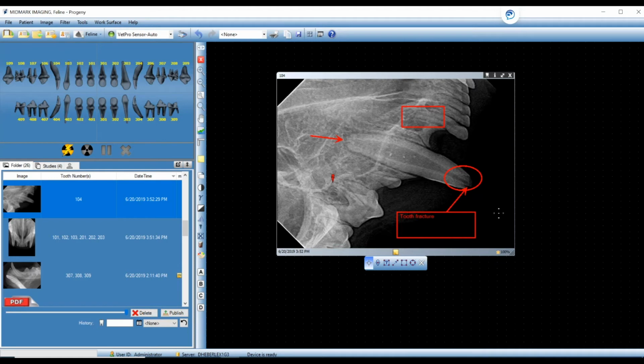And that's how you use the annotation toolbar. Now, if you wanted to delete any of these annotations on an image, what you need to do is make sure you're in that annotation toolbar. So you want to be able to see these tools down at the bottom of the image. And let's say we want to get rid of this particular annotation.